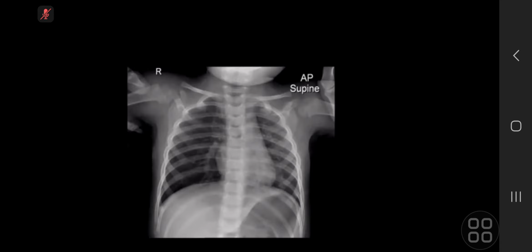This is a frontal chest radiograph of a child. The most obvious abnormality is expansion of the right hemithorax, which also appears to be lucent. My first differential would be a foreign body inhalation on the right-hand side. Other differentials to consider would include Swyer-James syndrome or Poland syndrome. I would correlate with the history, and if there is concern for foreign body inhalation, recommend fluoroscopy or expiratory radiographs.